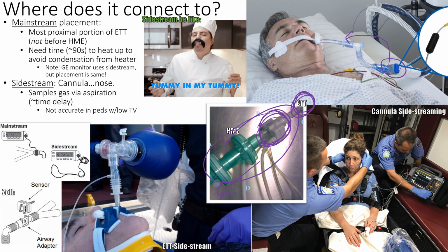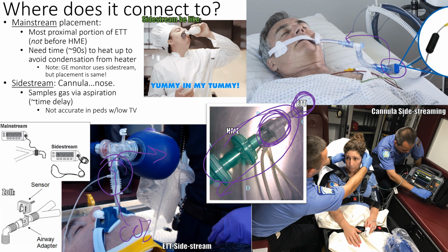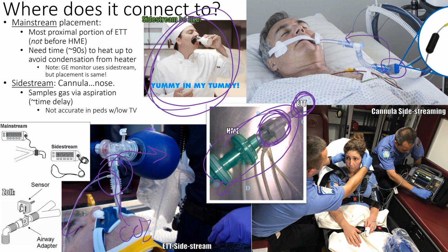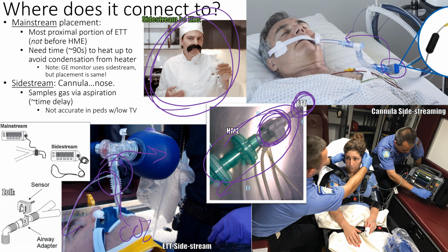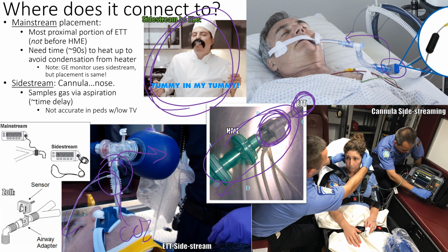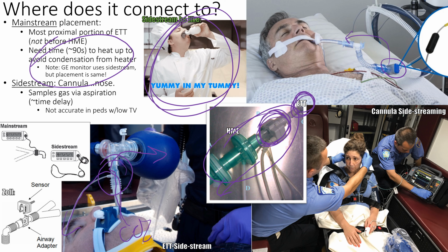Okay, so this one right here is a side stream, right? So as the patient exhales CO2, some of it goes out, but we also measure a little bit on the side, right? All right, there's a little time delay. In pediatrics, they can't really use it because the volumes of the kids are not as big as our side stream adapters, so they do have to use the IR ones. Okay, and again, it takes about 90 seconds to heat up on the Zoll defibrillator.